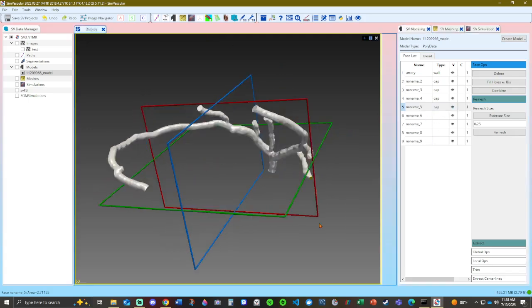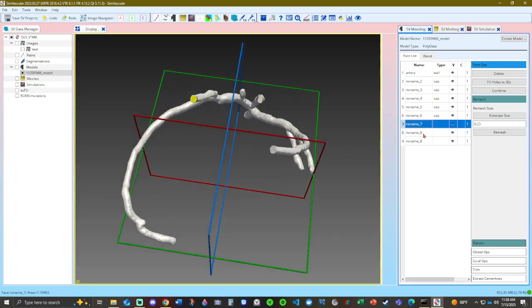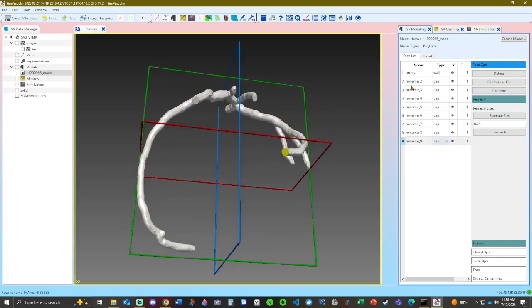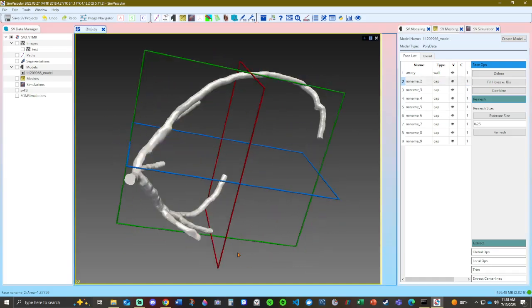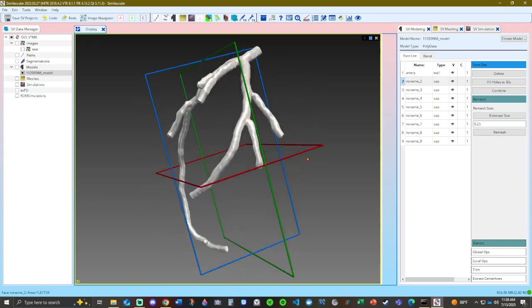Cap, just making sure that they all exist, because in some cases there will probably be a mistake or a blemish, and then you can name them accordingly. Let me just do that really quickly with the naming convention that we have.